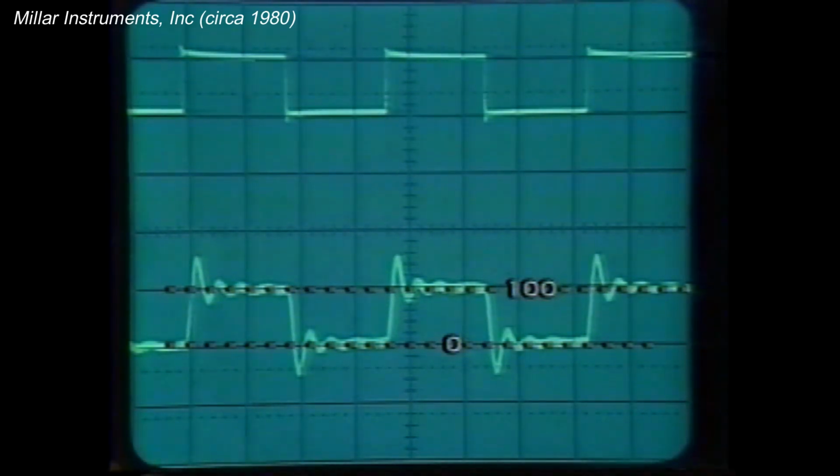A patient monitor, which can only interpret from the electrical signal applied to it, would indicate that this patient had a systolic pressure of 150 millimeters of mercury and a diastolic pressure of minus 50 millimeters of mercury, and might very well indicate that the patient needed medication that was really not necessary.